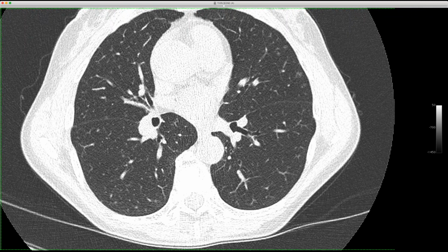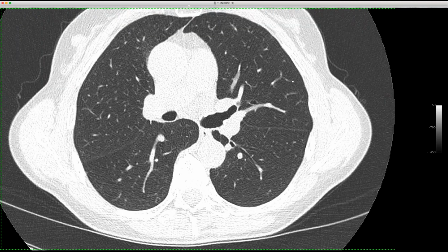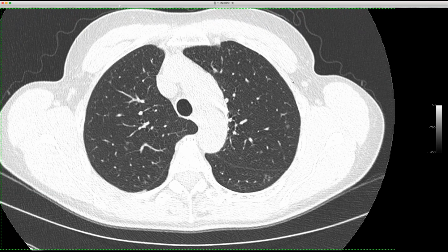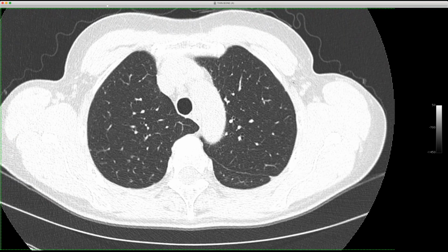But it's interesting. I was digging through the literature a little bit, and people have reported large ones. They've reported them mimicking metastases. I would argue this pattern could potentially mimic airway spread of adenocarcinoma if you had a lung cancer. But I think once you've seen a case of these, you recognize them. For some reason, I don't know why they have them. The pathologists see them all the time to the point where they don't even mention them.